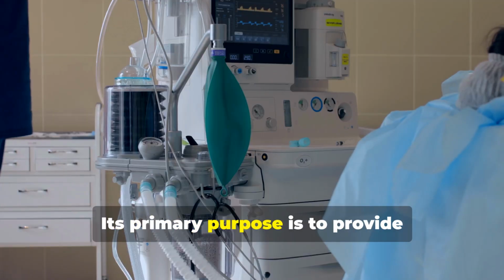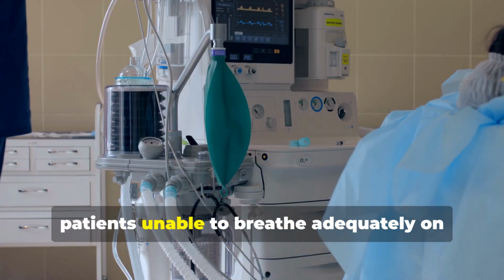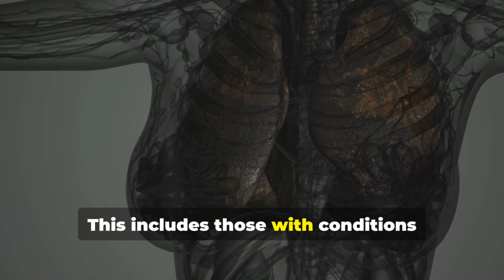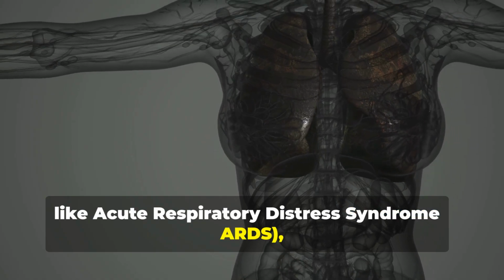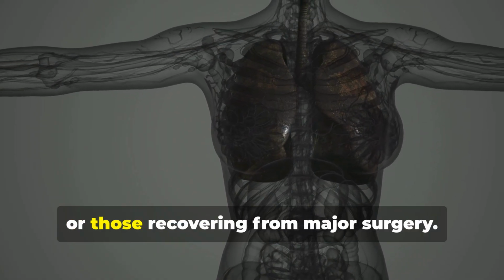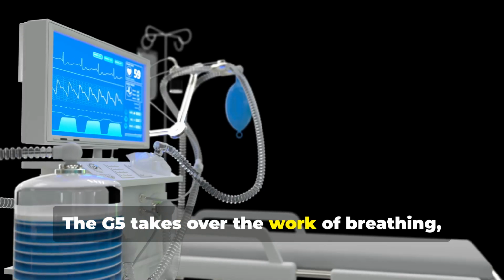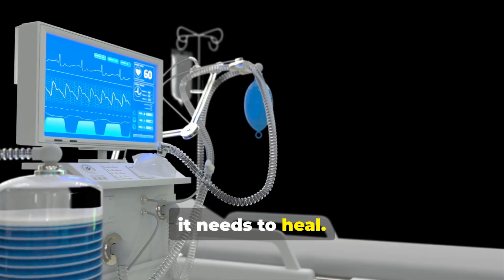Its primary purpose is to provide life-sustaining respiratory support for patients unable to breathe adequately on their own. This includes those with conditions like acute respiratory distress syndrome, ARDS, severe pneumonia, or those recovering from major surgery. The G5 takes over the work of breathing, ensuring the body receives the oxygen it needs to heal.